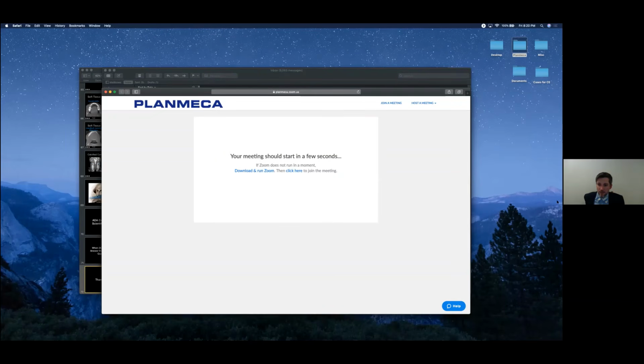If you were to make a pan from a cone beam scan, you might notice it does not look as, quote unquote, pretty as a conventional 2D, but you get much more diagnostic information from taking a scan and looking at the patient in all three views. So if you can take a scan at a lower dose than a pan, my vote would be to take a cone beam.